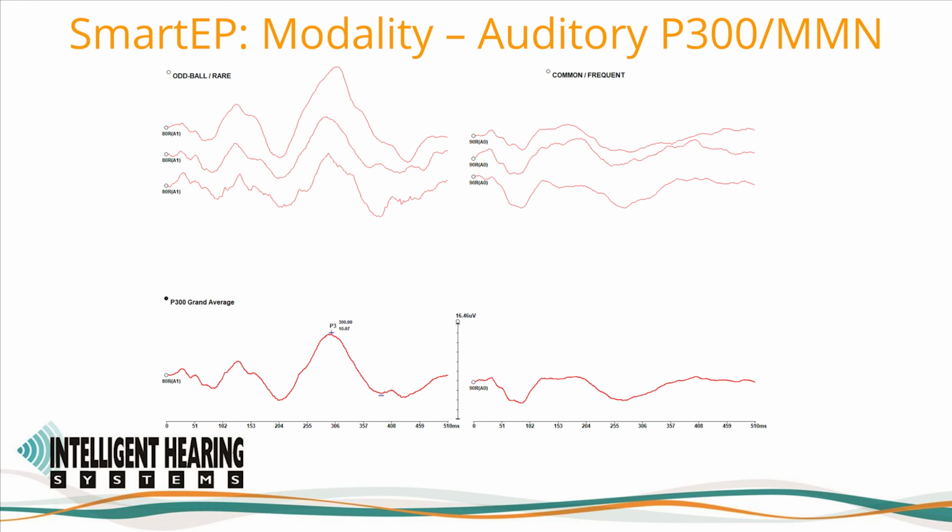Note, the patient should be alert, staring at a target, minimizing any eye blinks, and should mentally count the oddball stimuli during the test. Inform the patient that they will be asked how many oddball stimuli they heard at the end of the test. This will motivate the patient to keep attention on the task. Some clinicians have used a push button or retractable pen and have the patient gently press down on the push button or pen each time they hear and count an oddball stimulus being presented. This helps the patient keep alert.